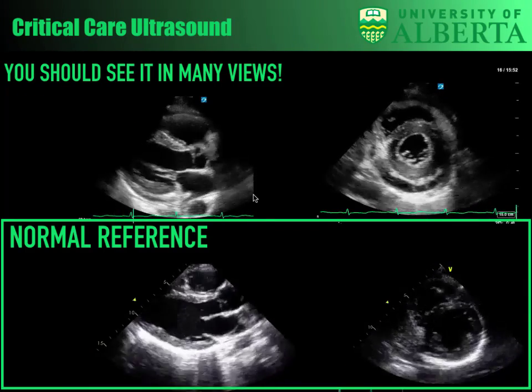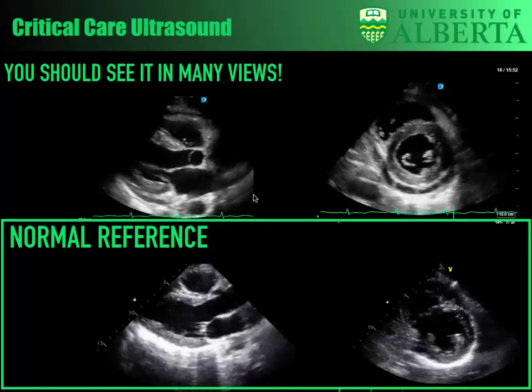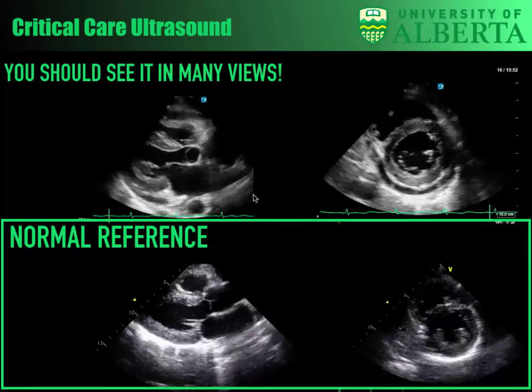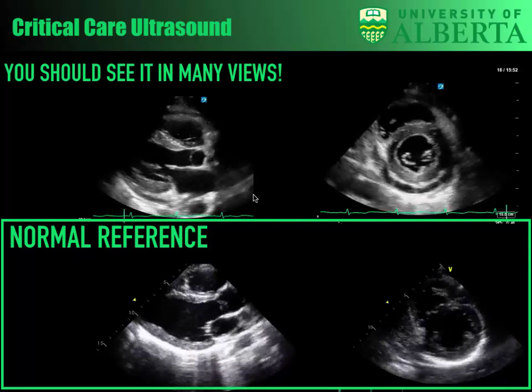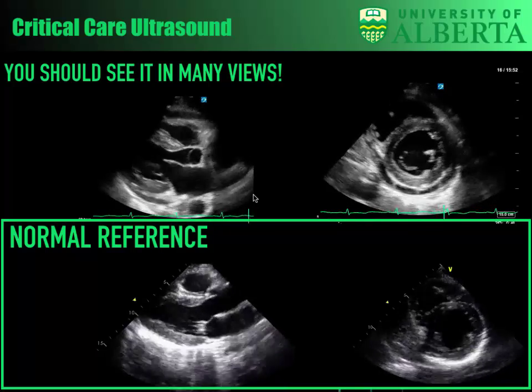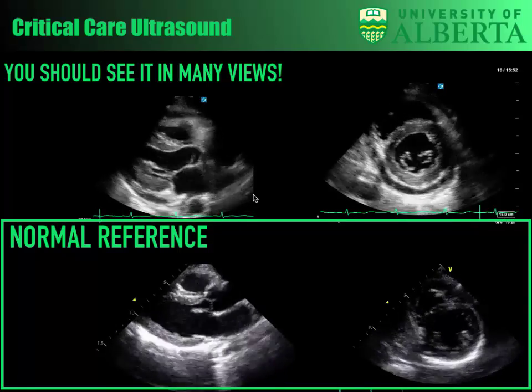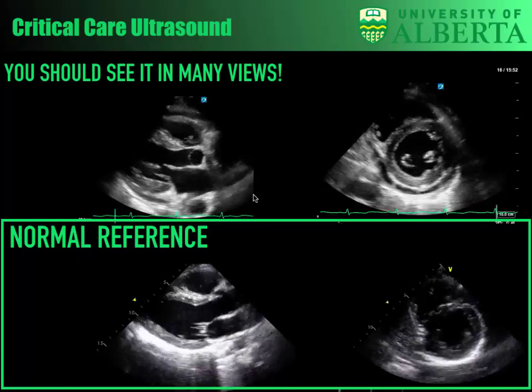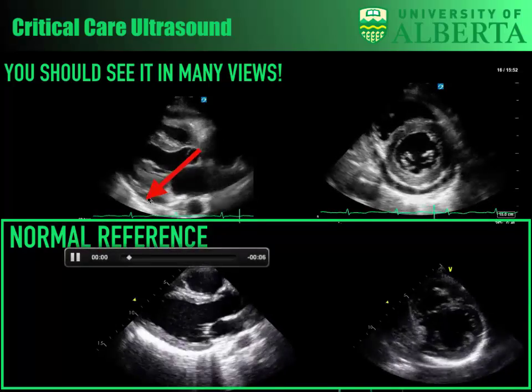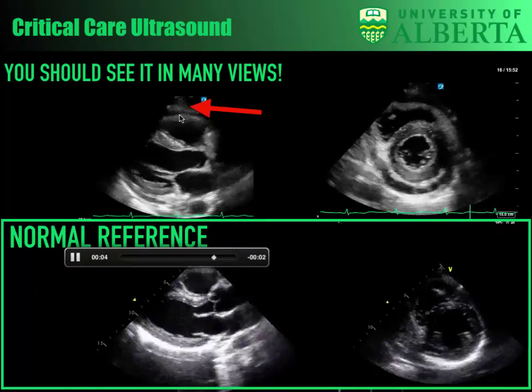The next thing is that you really see it in many views. Pericardial effusions, if they're circumferential and surrounding the heart, are seen in many views. There can be incidences of local pericardial tamponade, but they're far less common, and for the sake of this talk we're not going to touch on that. Our focus is on circumferential and symmetrically distributed effusions. So you can see here in the top left, beneath the posterior wall, there's an anechoic collection. Also anteriorly, there's an anechoic space.